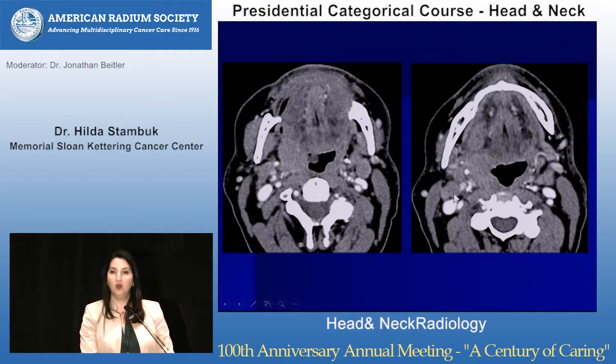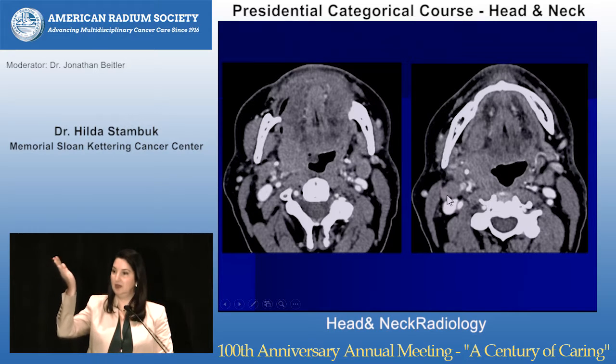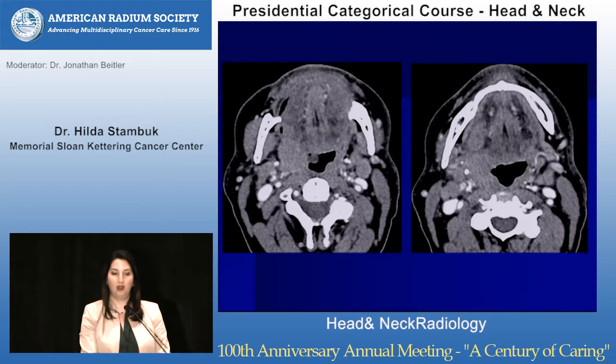But if you look north, we looked for the nasopharynx, soft palate not involved. They looked down, it didn't go down into the hypopharynx. But now we've got to look forward into the oral cavity. And here's a normal muscle called the hyoglossus muscle. And you can see, even if you don't know your anatomy, that this is asymmetric relative to the opposite side. This tumor is tracking into the extrinsic muscle of the tongue, the hyoglossus muscle, and it's a very important tumor. This makes this patient T4.